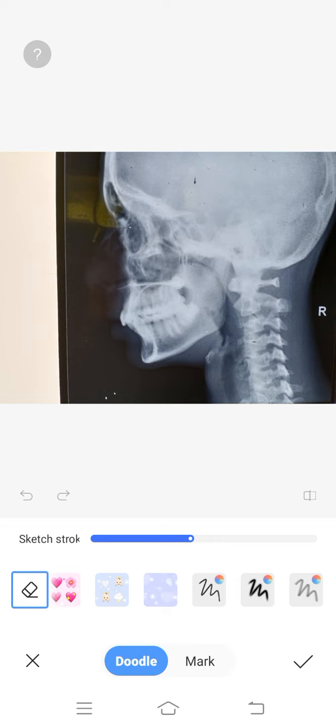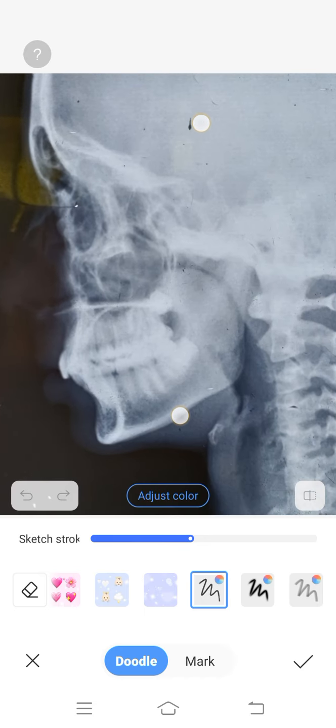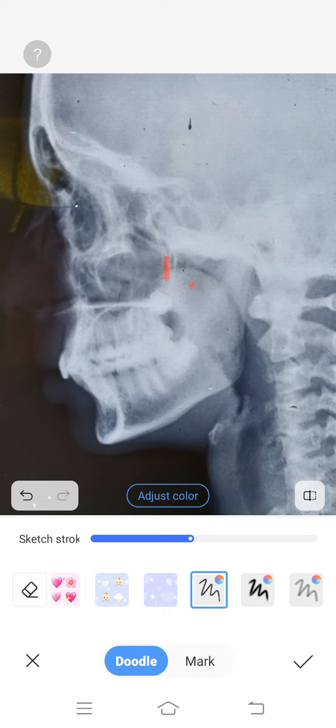So this is X-ray soft tissue neck and nasopharynx lateral view. And what does this show? So let us see. This is a nasal cavity. So here comes the choana, and this part is the nasopharynx region. This is the hard palate, and here comes the soft palate.